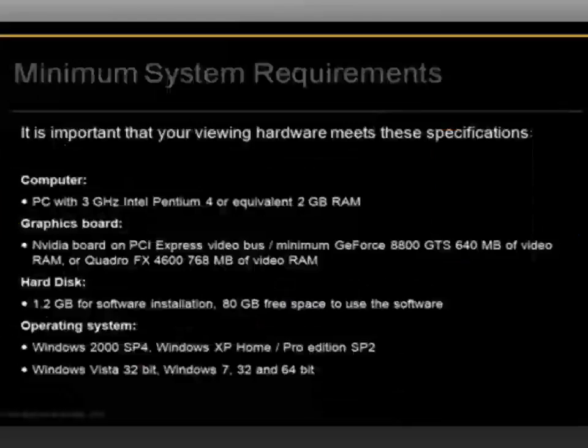You are now prepared to use CS3D imaging with full virtual implant and implant library functionality. Please take note of the system requirements for best software performance.